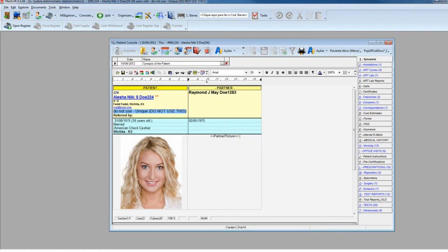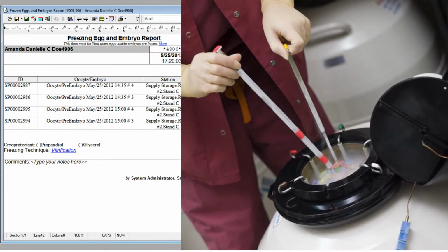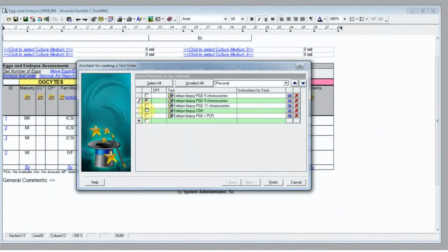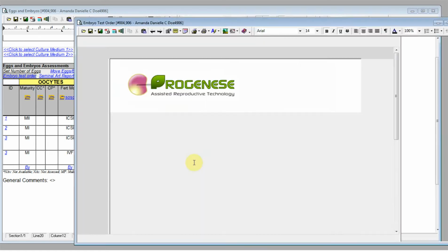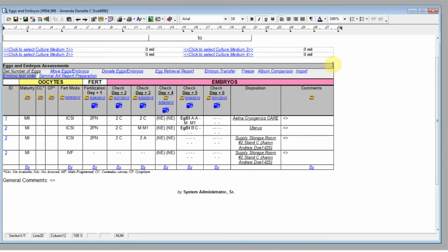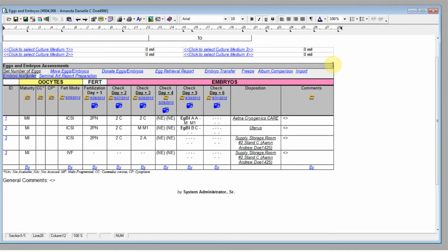Other resources like controlling of the processes of freezing and thawing embryo, tests, orders and results, complete the system of ART cycle management, allowing a test order recorded to be integrated with the results, directly and closely connected, each one with its own embryo.